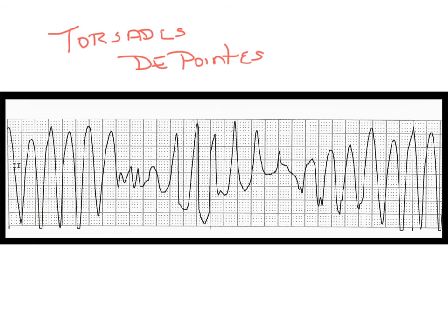Torsade de pointes. Torsade de pointes actually means, in French, twisting, I think it's French, of the point.